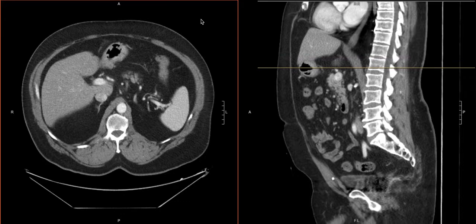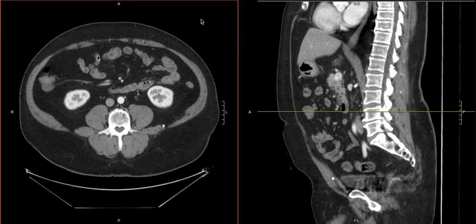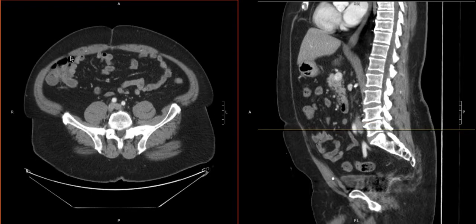And a lot of what we're looking for are things like hernias or soft tissue defects, any air. As we come down here, we can see we're coming actually to the umbilicus. This is why the reference lines are so helpful. So this is normal. That's just the umbilicus there, but we're keeping an eye out, looking to see if there's anything that's herniating between the muscles into the soft tissues.